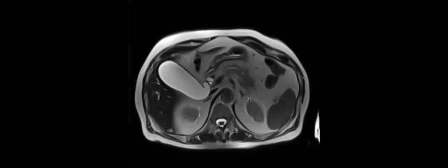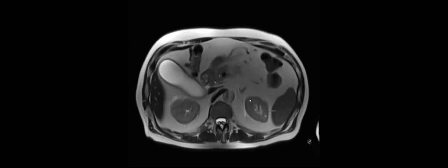They ended up getting an MR. Unfortunately, for whatever reason, it was a non-con, but the MR is very helpful. You can see that there's severe bile duct dilation. And then we've got this evil gray mass here with some little dilated side branches in it. And the pancreatic duct is going away right there. And then very clearly on the diffusion, you can see that there's actually a pretty big mass here.